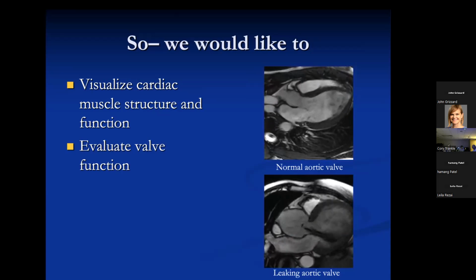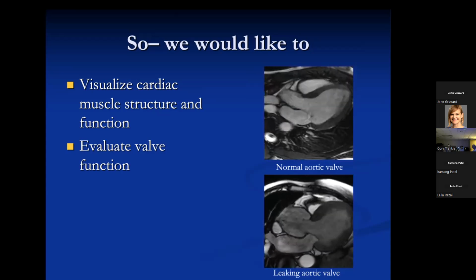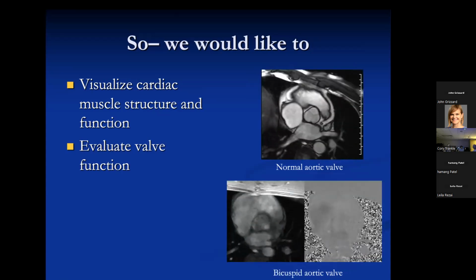This is important because later we'll be trying to quantitate retrograde flow, and we'll be using a phase contrast velocity encoded sequence. Interestingly, the information that you want is encoded in the phase pixels. Well, if you think about it, the phase pixels here are all messed up. You have dephased these pixels. So you're going to have a problem when you try to use the retrograde through plane flow sequence to understand how much regurgitance you have. You can see why the spin information is encoded in the phase pixels and they are dephased, so you're going to lose those pixels.